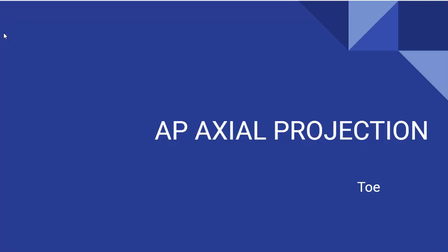Welcome to the image analysis of the toe. We will be reviewing the common projections, the AP axial, oblique, and lateral projection of the toes in the image analysis guidelines. We will review some common positioning errors and how to take corrective action.